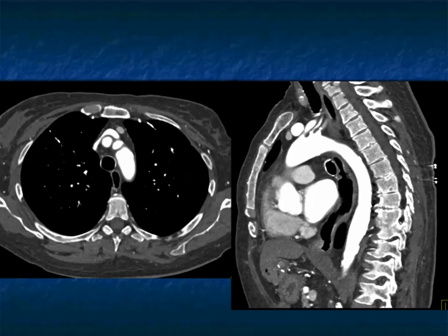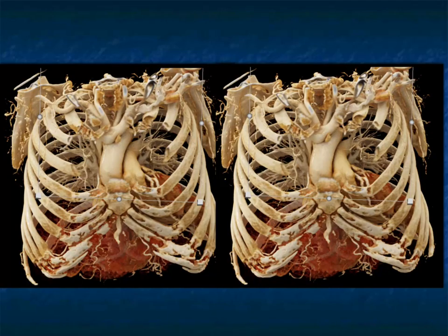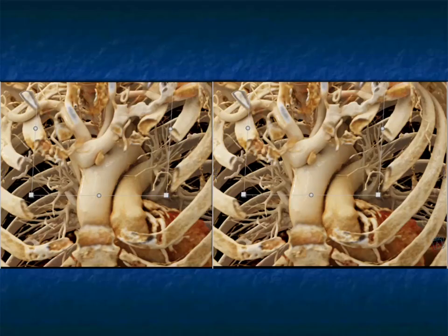Again, it's hard. You need to be very careful. It's a small lesion. It's indeed very, very challenging, whether it's axial or cinematic. But there it is on both of them, just really nicely shown on the cinematic rendering. Now, one of the things about cinematic rendering, it is very good in the mediastinum and many other areas.